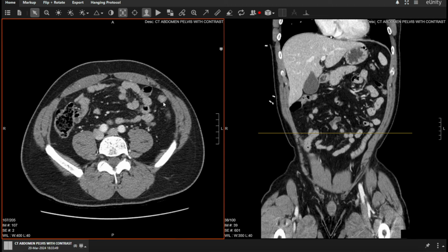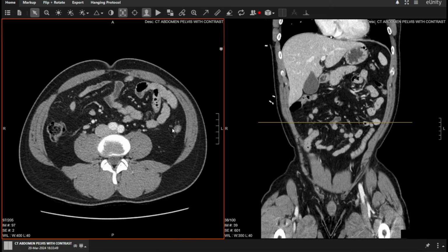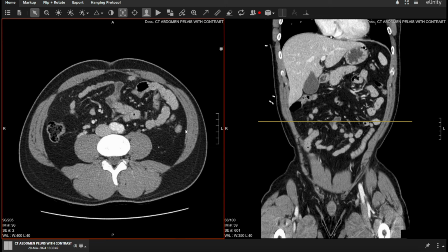The ascending and descending colon are partially intraperitoneal and partially retroperitoneal structures. So you're always going to be able to find them in the same place right around here for the descending, right around here for the ascending, because half of the structure is actually parked in the retroperitoneum and the retroperitoneal fat. And so that dives down right here appropriately. Here's our descending colon stuck halfway into the retroperitoneum. Conversely, here's your ascending colon also stuck down. So you know they're always going to be here and here.